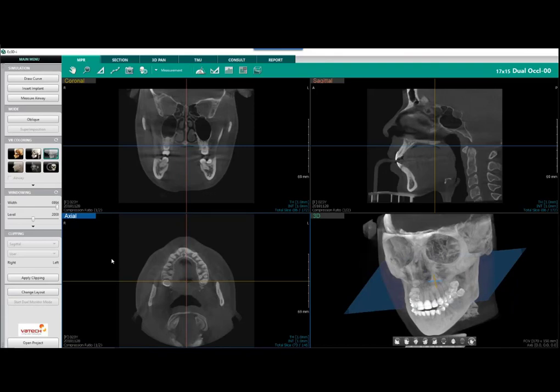What I would really like us to focus on today is that we're all at some variation of software knowledge base. What we're trying to bring to you today is a working flow of the software, so you can sit down and navigate 5 minutes to go through a scan, do your clinical planning, be it implants, endo, extractions, ortho, or airway, TMJ. We want to be able to go through this so it's not a burden, so we can just methodically go through the software there.